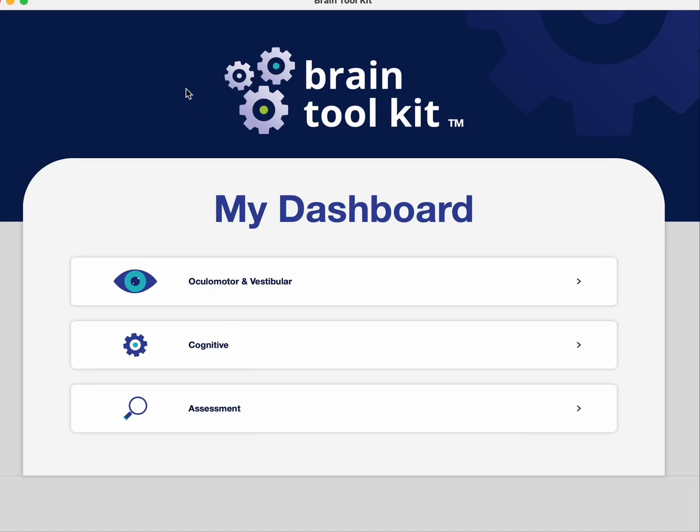Hey, and welcome to the Brain Toolkit app. This is your dashboard. I'm going to bring you through all the different activities and how to leverage them. So this is your homepage.